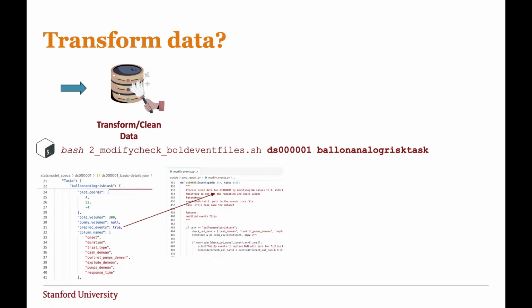Modify the information using this format, because currently the data are messy or structured in an incorrect way, and I need to fix it the same way for everything. If you're not familiar with Python, I encourage you to not fear and just use Claude or GPT, and success will be near, because it is really good at these types of things if you give it clear instructions and an example, which already is there.